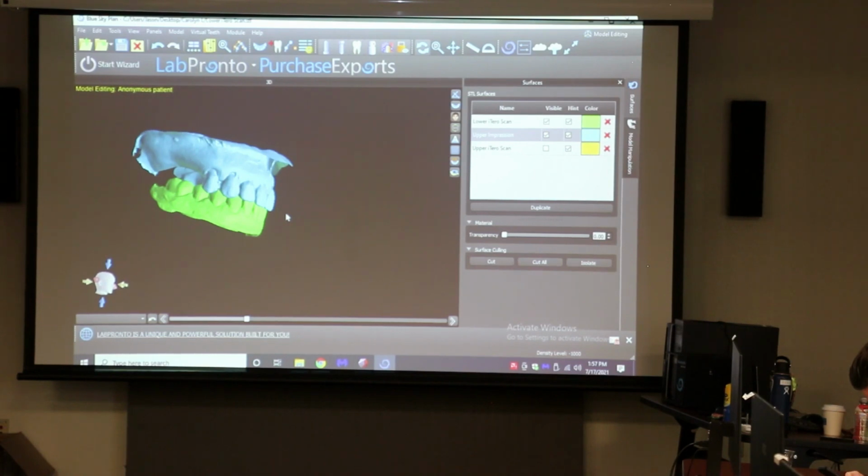So we had a blue and a yellow model, right? And that was your iTero scan, but you didn't have any vestibule on that. Right. So you captured a vestibule impression and got that digital, but now you had to use those common points to link it to the iTero scan or the intraoral, now that you have an opposing and a bite with your vestibule scan. Okay. So it was all just to be able to get a vestibule scan, your opposing, and mounted together. Okay. So now we're mounted.